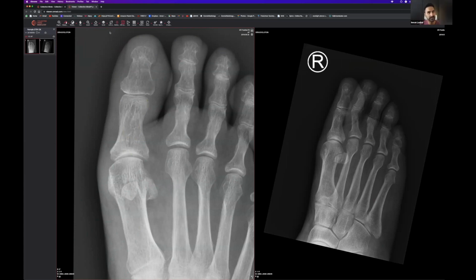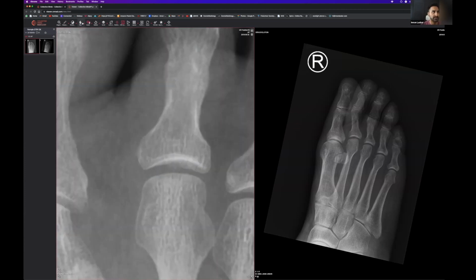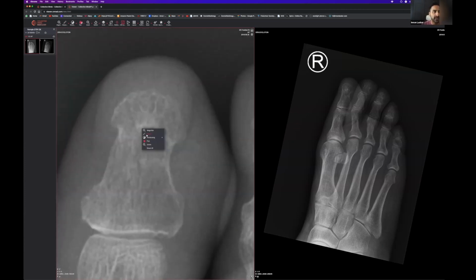I'm trying to allude you to something earlier, try and build on what we saw before. If you did draw a line around that nail bed, you can see that nail bed goes like so, but there is another radiolucency that goes along like this, all the way along like this, and all the way along like this. Can be quite subtle. People can kind of ignore it. Let's zoom in just to convince everyone that I'm not telling lies. Have a look. So let's draw that nail bed like so, all the way along like this. And the nail bed's not going to go this way, is it? You can kind of see the nail bed going along that way and that way like this. It doesn't have that hyperdense appearance of someone getting some nail work done. This is a radiolucency going right through that terminal tuft, and that is pretty abnormal.